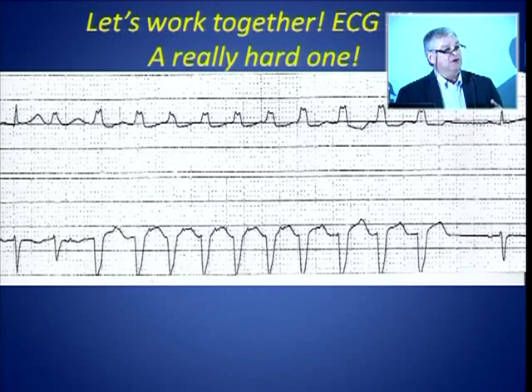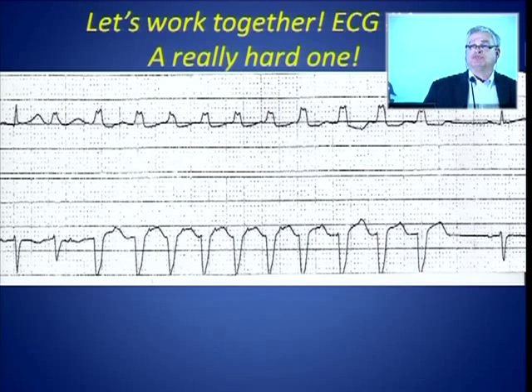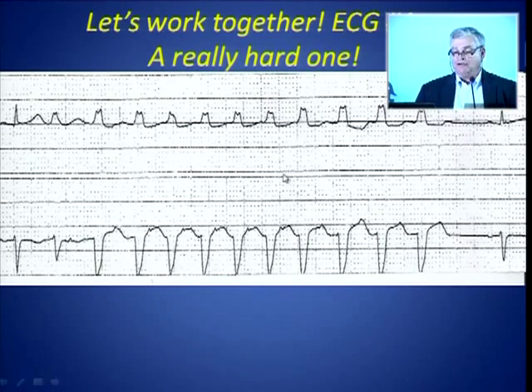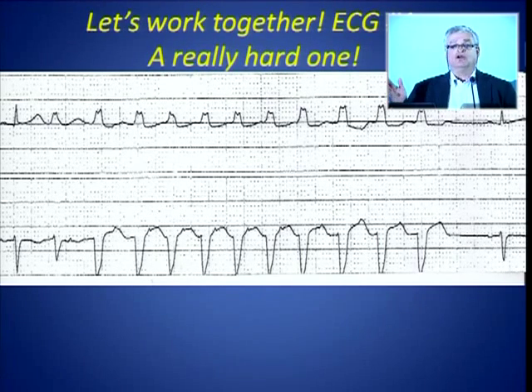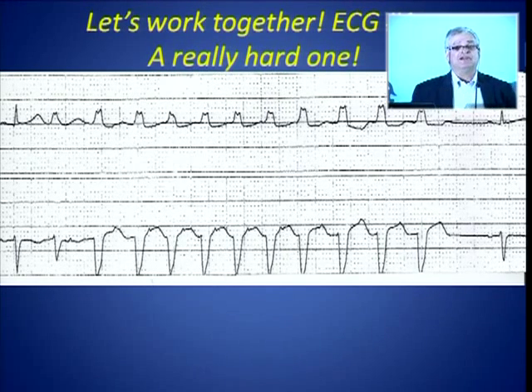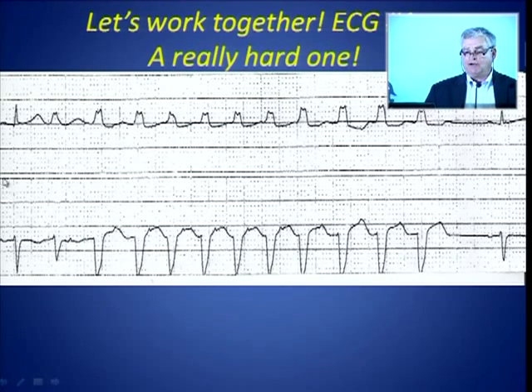Okay, let's go. So here is the hardest rhythm ECG you're ever going to see. A nurse calls you. They saw this on the monitor upstairs. It's easy to look at, but I can tell you that it's not always that easy to determine what's going on. So let's do it. Let's have a look at it. Well, what do we see?